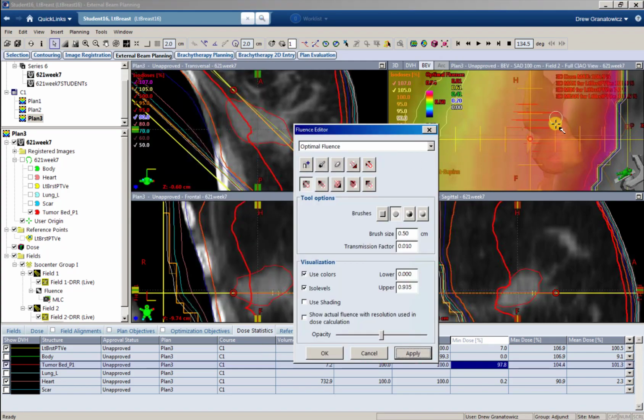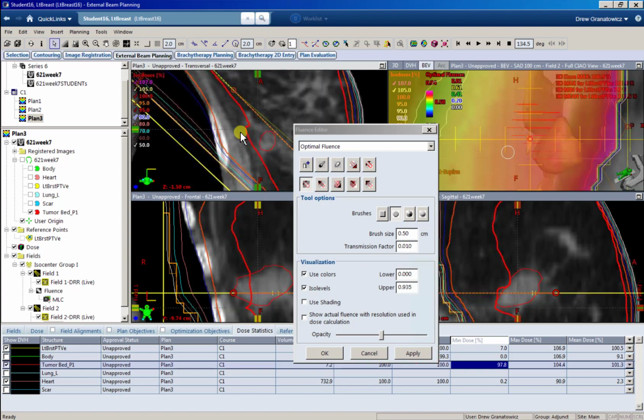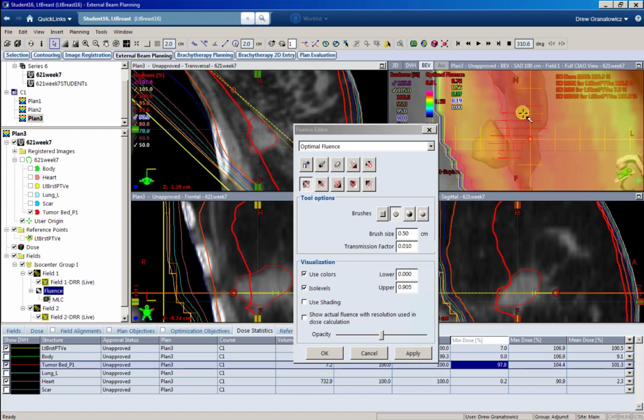That's good. But if you were paying close attention, the 107 cloud or the 105 cloud did go up. So we are slowly increasing our coverage. This bottom slice is okay, so I'm going to try to not go all the way down here, okay? I'm going to just do the top portion, kind of stop right above that bottom slice there.